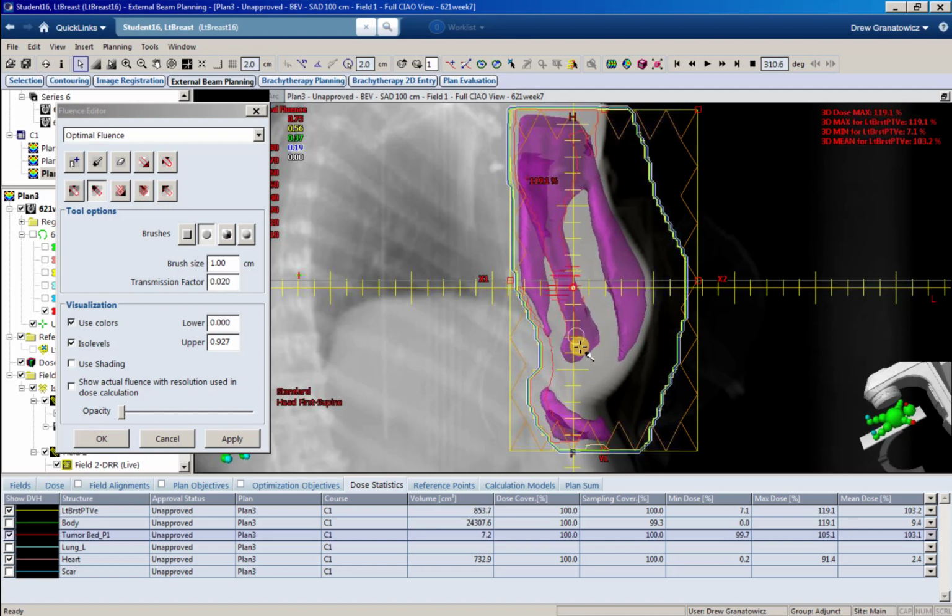So I'm literally just going to try to paint all this down by 0.02 without unclicking, just so I don't accidentally take too much off of any given spot. When I feel like I've got it all, I let go, and then I can go to my next spot.